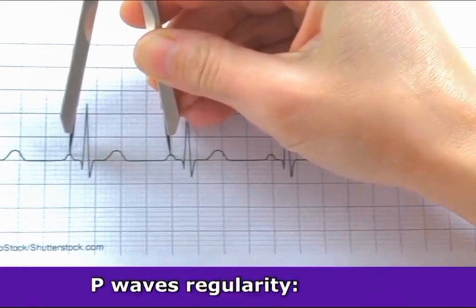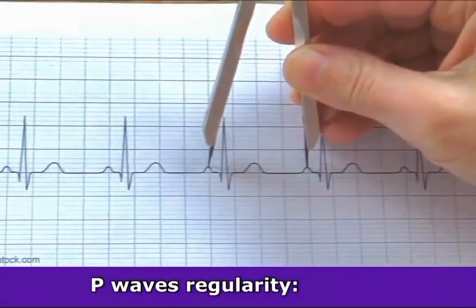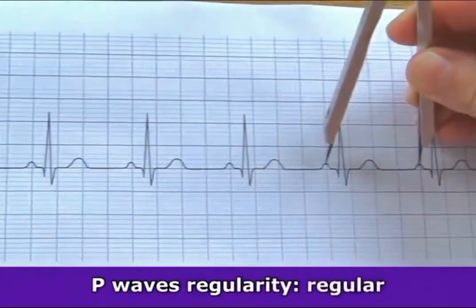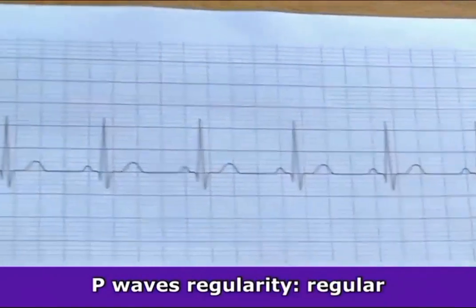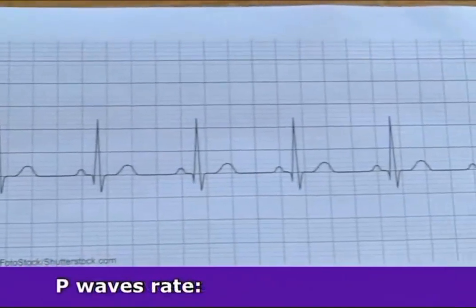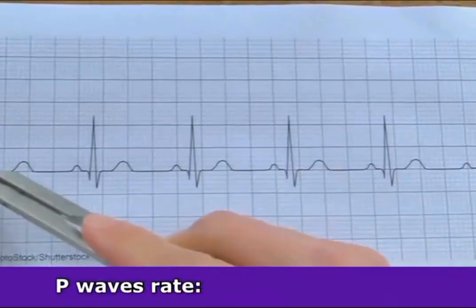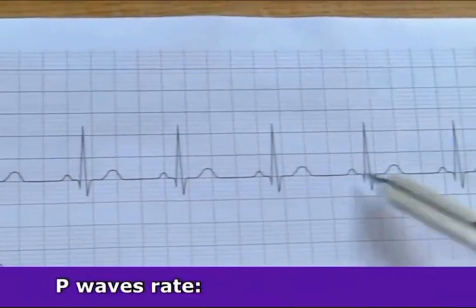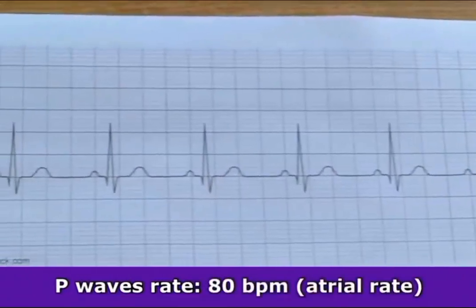Making sure that they line up. And so far, they have the same distance. Okay, they are regular. Next, we're going to look at the rate. So what we're going to do, since we have a 6-second strip, we are going to count the P waves and then multiply by 10, and that's our atrial rate. So 1, 2, 3, 4, 5, 6, 7, 8. 8 times 10 is 80, so we have an atrial rate of 80.